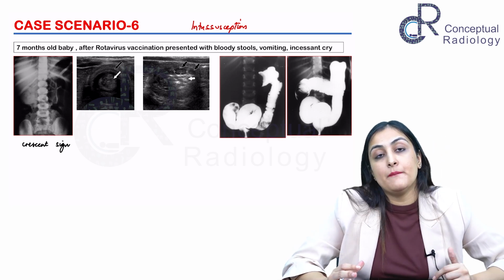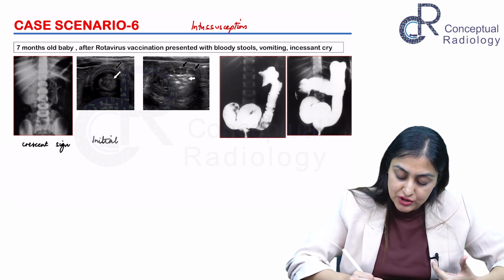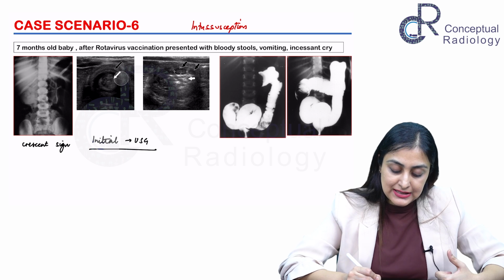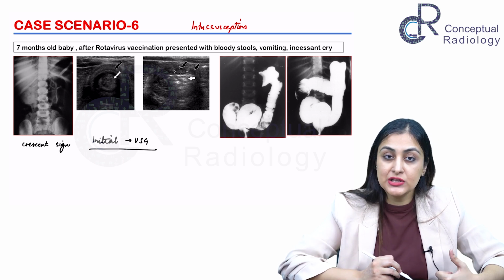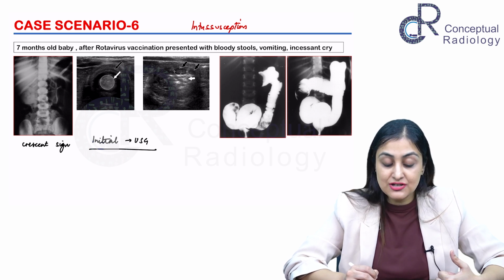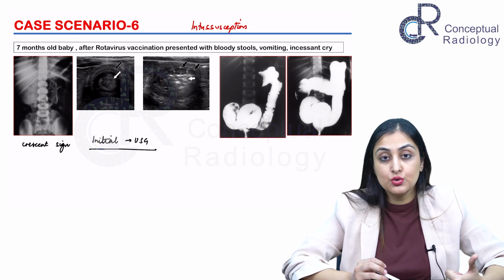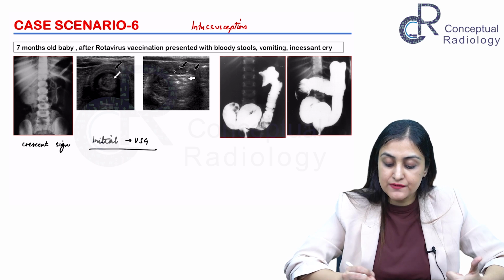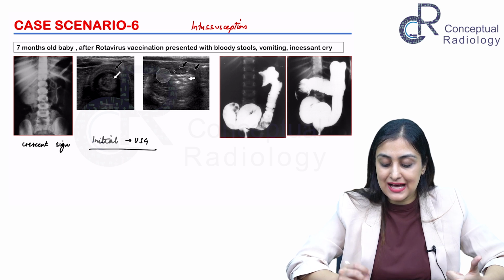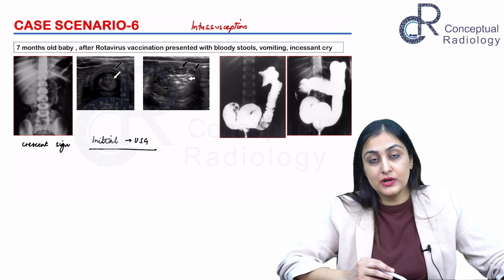One of the most frequently used initial investigations here is ultrasound, right? What you're going to do first, and something which is diagnostic, is ultrasound, wherein you see two bowel loops, one within the other, producing a sandwich of sorts. You can also see the hyperechoic mesentery, which differentiates the two bowel loops. This is a transverse view. On a sagittal or longitudinal plane, you again see this appearance with hyperechoic areas. A lot of times you can also see mesenteric lymph nodes inside, right?